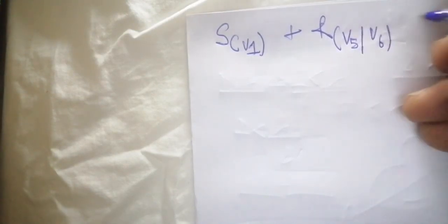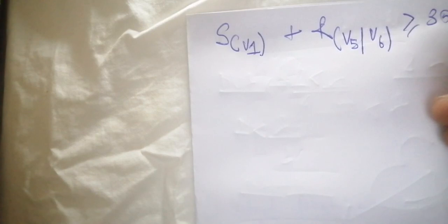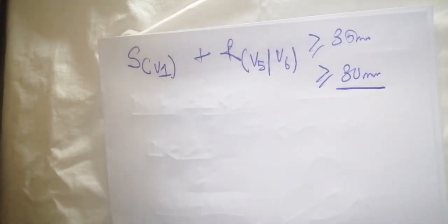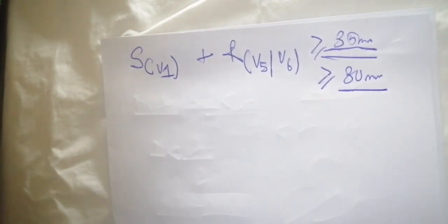Now, what we are going to see here is going to be the Sokolow-Lyon index. This other one is going to be sent through comments. Now, the Sokolow-Lyon index states that the S wave of the chest lead V1 plus the R wave of the chest lead V5 or V6 being greater than 35 millimeters in men and greater than or equal to 30 millimeters in women corresponds to a left ventricular hypertrophy. But generally, just put in mind 35 millimeters.